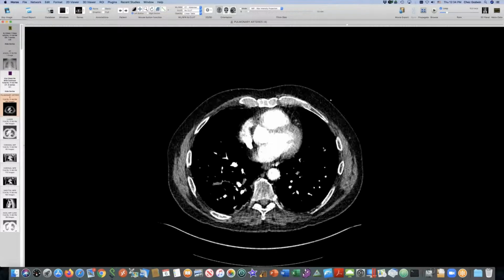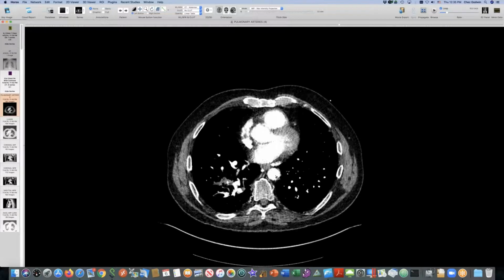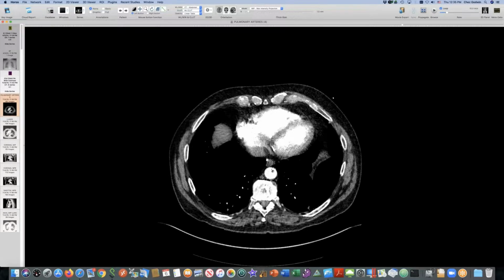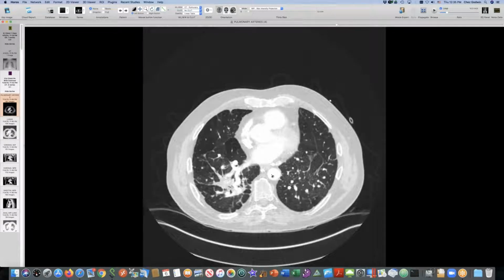So this guy has the high attenuation material in these subpleural deposits. He's got the paraesophageal lymph nodes. He's got the work history of being in construction. Look at all these paraesophageal nodes down here. And I think this is another one, more of them down here. This has got to be silicosis rather than sarcoid. Okay, so I think that the high attenuation stuff in that subpleural location, sometimes frank pseudoplaques, really favors silicosis over sarcoid, if you haven't heard me so far.